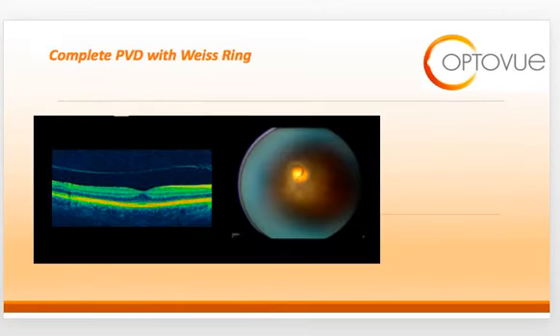Here you can see a complete PVD, or a stage 4 complete PVD. Actually, this wouldn't even be vitreomacular adhesion anymore, because now the PVD is completely free, and you can see it floating there in the vitreous space. And on the right-hand side of the picture, you can see what we call a Weiss ring. When you see a Weiss ring, this is an indication that the vitreous has completely detached from the retina.